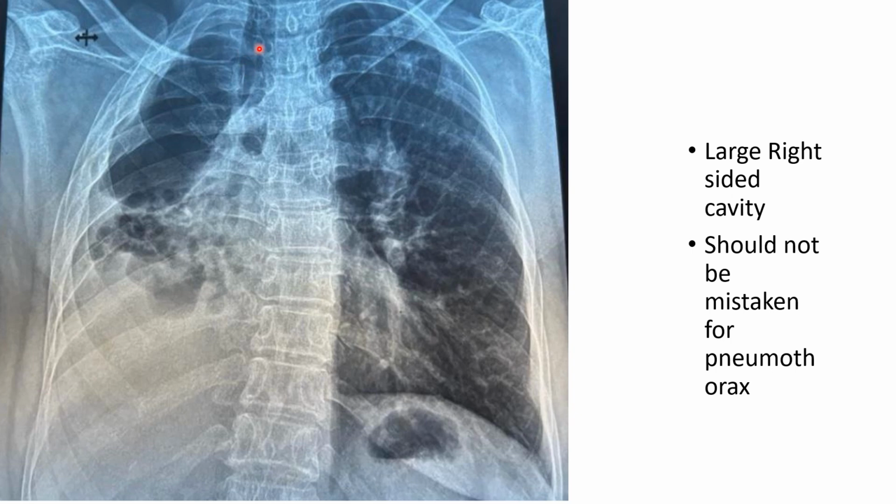In this x-ray you can see a right fibro cavity. So this big one is a cavity. It is hyperlucent in the sense it is dark, and it is avascular with the absence of bronchovascular markings. See the bronchovascular markings here? None of them is here. So it is a cavity. The wall is thin.